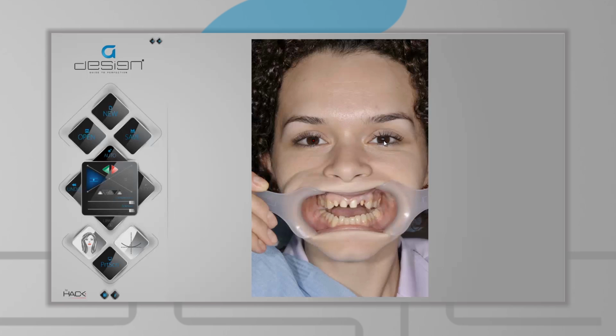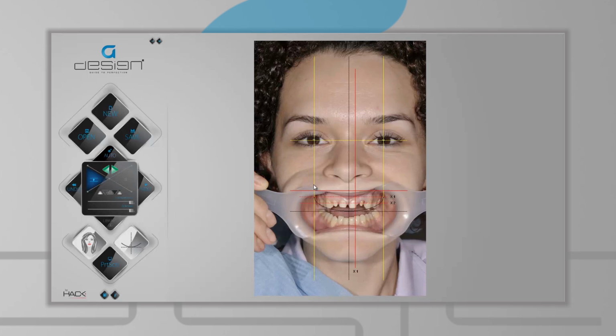Prosthetics. Digital prosthetics, full ceramic veneers and crowns. After determining the symmetric points, the application will automatically rotate the picture so that the line between them is perfectly horizontal and will then position the facial axes, the incisal edge, and the guiding lines. All these marks can be set manually depending on the case to render the needed information for an accurate design.